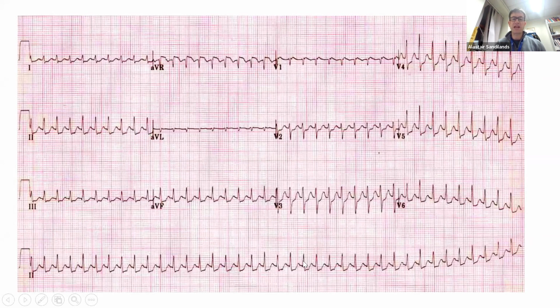Okay, so it's regular. Now we're looking at the heights. If you look at the heights of the QRS within a given lead, they look the same, and they match. If you just scan, all of them match. The slight uplift here in the baseline, I agree, but generally on the whole, they are very regular and the same height within a given lead.